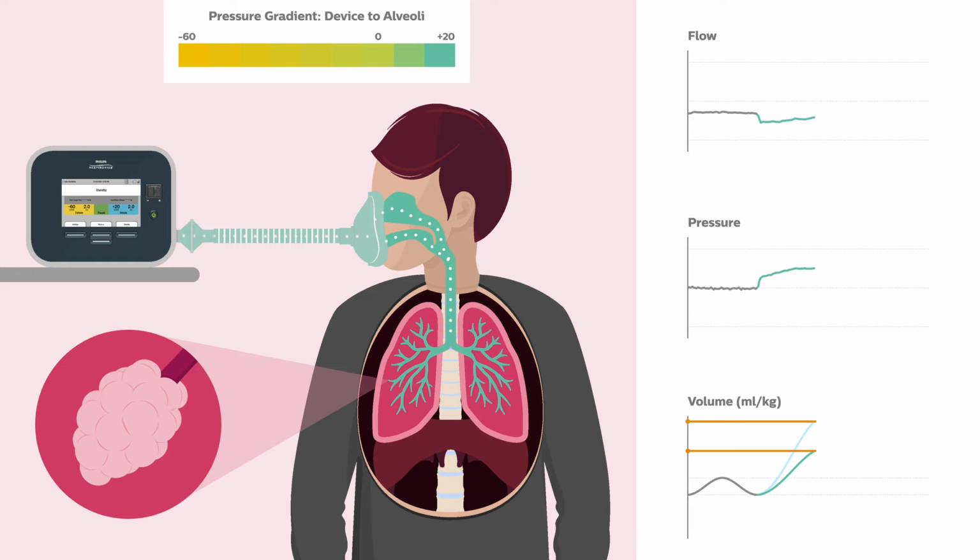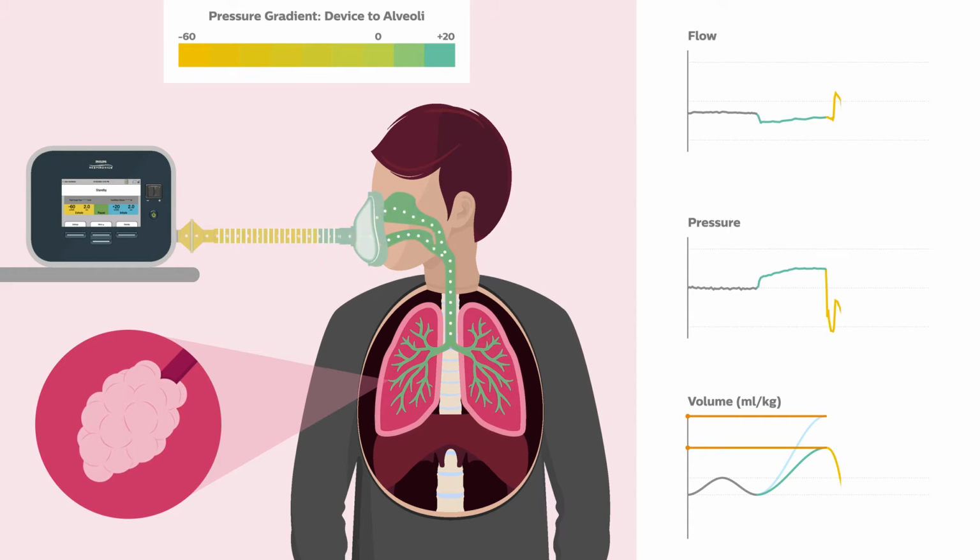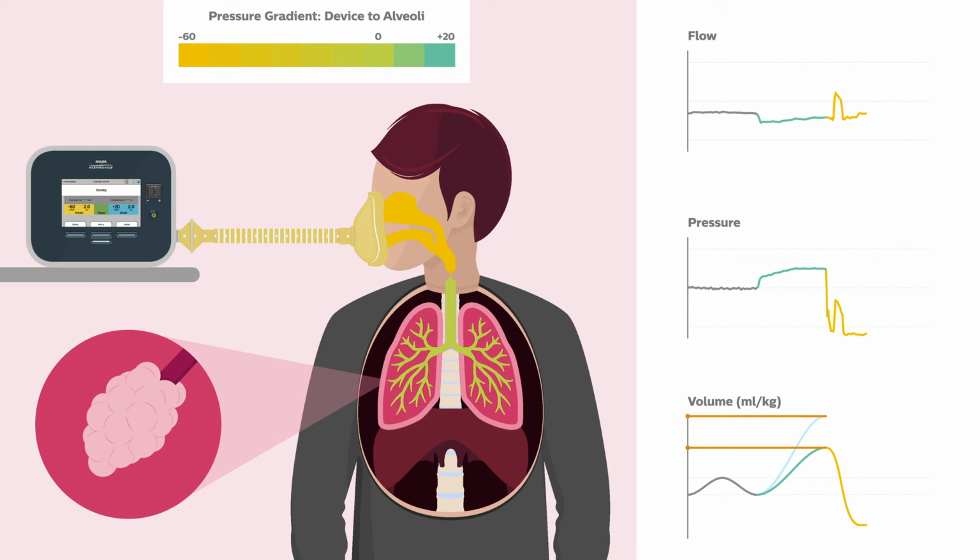However, a decrease in lung volume results in a decrease in lung recoil pressure, which combined with a larger magnitude negative pressure setting, empties the lung quickly to the patient's functional residual capacity point prior to the end of the exsufflation phase. This shifts the zero pressure point to the right, allowing negative pressure to enter the upper airway.